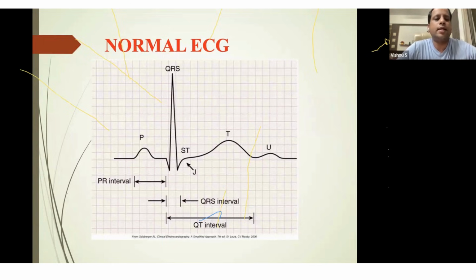അപ്പോൾ ഫസ്റ്റ് നമ്മളൊരു നോർമൽ ECG ട്രേസിങ് എടുത്താൽ ഫസ്റ്റ് P വേവ്, ഫോളോഡ് ബൈ QRS, ദെൻ ST സെഗ്മെന്റ്, T വേവ് ആൻഡ് U വേവ്. അപ്പോൾ PR ഇന്റർവെൽ എവിടെ തൊട്ട് എവിടെ വരെയാ നോക്കുക? PR ഇന്റർവെൽ ബിഗിനിങ് ഓഫ് P വേവ് തൊട്ട് സ്റ്റാർട്ടിങ് ഓഫ് Q വരെയാണ്. Q കാണാം, ചിലപ്പോൾ R മാത്രമേ കാണുകയുള്ളൂ. അപ്പോൾ അവിടെ വരെയാണ് PR ഇന്റർവെൽ എടുക്കുക. ഓരോ ഇന്റർവെലും നമ്മൾ ഡീറ്റെയിൽ ആയിട്ട് പറയാം. അതിനകത്ത് എന്തൊക്കെ പ്രോബ്ലംസ് ആന്റിസിപ്പേറ്റ് ചെയ്യാം, അത് ക്ലിനിക്കലി എങ്ങനെ ടോളറേറ്റ് ചെയ്യാം എന്നുള്ളത് കറസ്പോണ്ടിങ് ആയിട്ട് വരുമ്പോൾ പറയാം.